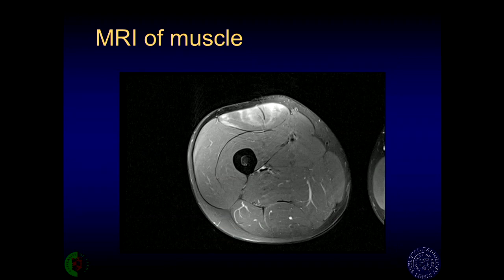Luckily, this lack of detail in the muscle isn't so important, because when muscles get damaged on MRI, they tend to get edematous or hematoma forming within the muscle, and that makes muscle imaging with MRI extremely sensitive to muscle change. Sometimes it can even be too sensitive, because often athletes recovering from muscle tears can have quite dramatic muscle MR changes, but be ready to return to play with really good, strong healing having occurred.